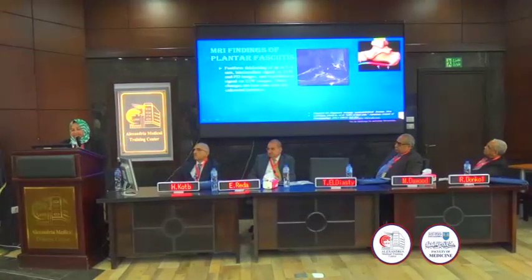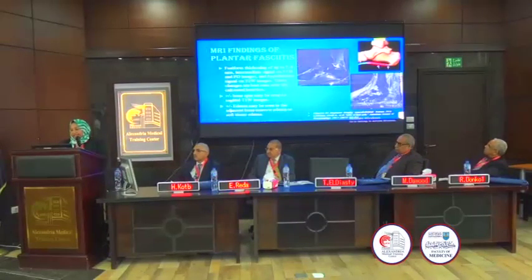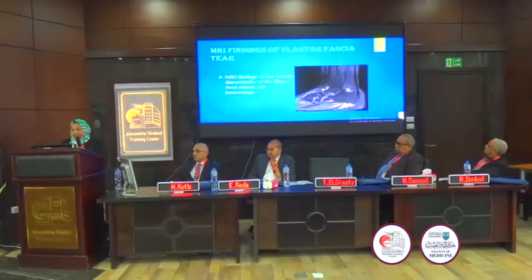It's not necessary to find a calcaneal bony spur, and reactive bone marrow edema at its calcaneal insertion and associated soft tissues. Plantar fascial tear or plantar fascial rupture also is not that common, but it's a condition that we need to consider from time to time, diagnosed by disruption and discontinuity of the fibers with edema or hemorrhage at the site of the gap.